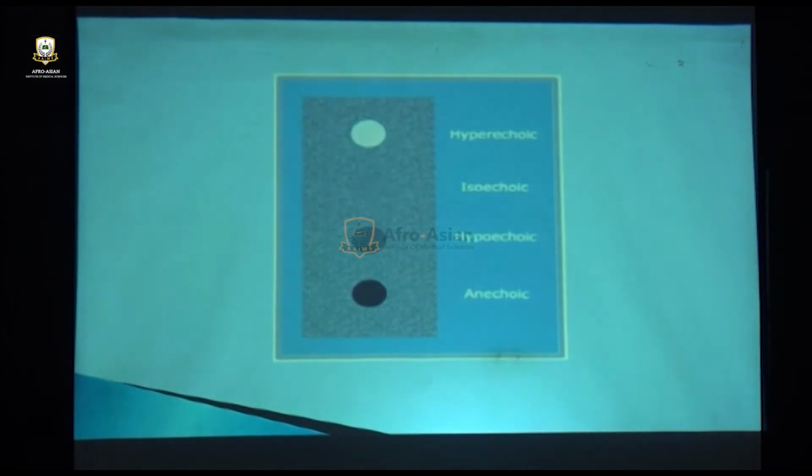अच्छा, अब हम इतनी बात कर रहे हैं echogenic, lucent, hypoechoic, this is how you differentiate. ये एक strip है which has a typical color, so this is called background color, ठीक है जी। The first one which is the most echogenic, the top one, this is white, very bright. In the sonography language it's called hyperechoic. उसके बाद आप देखें, this one is not visible at all, it's very subtle, and this is isoechoic. अच्छा जी, उसके बाद फिर ये आ जाए तो this has a different color.